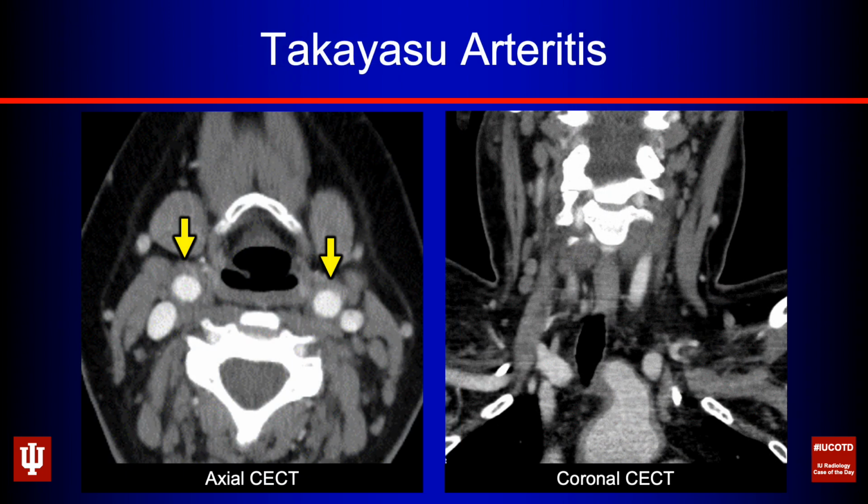Same patient. When we look on the axial CT, interestingly, this was bilateral, and this was extending really up and down the common carotid artery and not just the internal carotid artery. And so, sort of saying, well, maybe this is TIPIC, maybe it's just sort of an odd presentation, but then take a closer look. Whenever you see something like this, make sure to look at all the vessels.